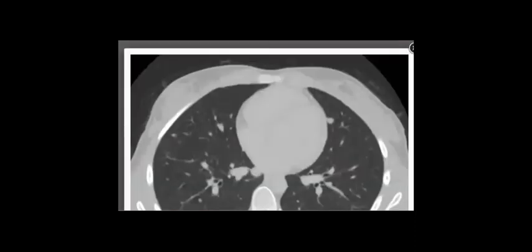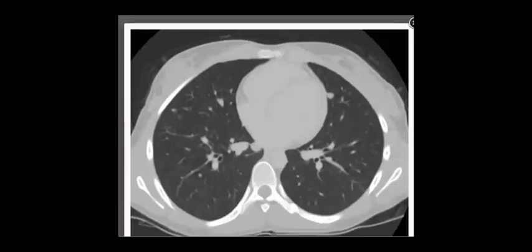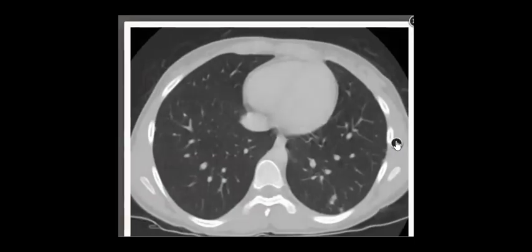So lung again. Do you see any abnormality here? So maybe bilateral nodules, maybe the largest one in this image here, or maybe, I'm not sure, this could be like a nodule, but maybe. Okay. In the other images, you can see that there are, again, multiple nodules.